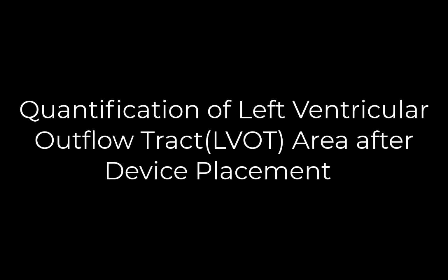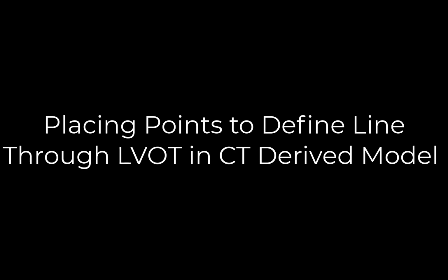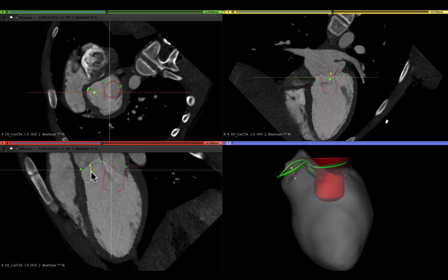Quantification of the LVOT area after virtual device placement has been suggested to be an important part of the preoperative planning for transcatheter devices. As such, we created a workflow to visualize the path through the LVOT.